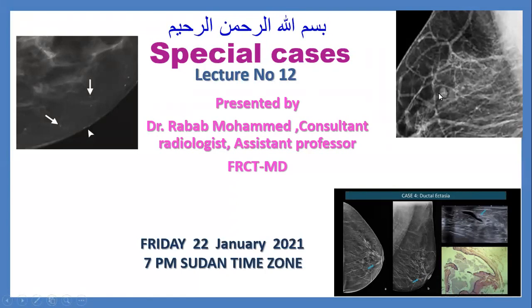Okay, so what is the remaining? What is this? This is a skin calcification. Skin change. Skin lesion. Skin lesions. Okay. Yes, skin lesions.